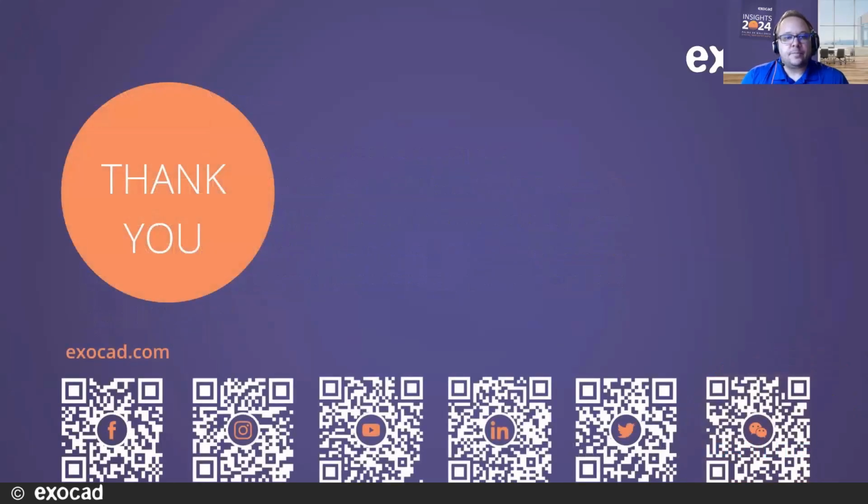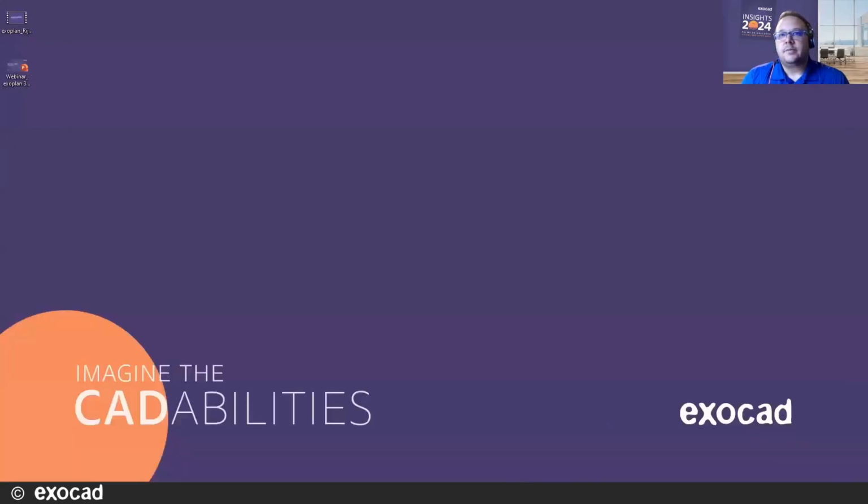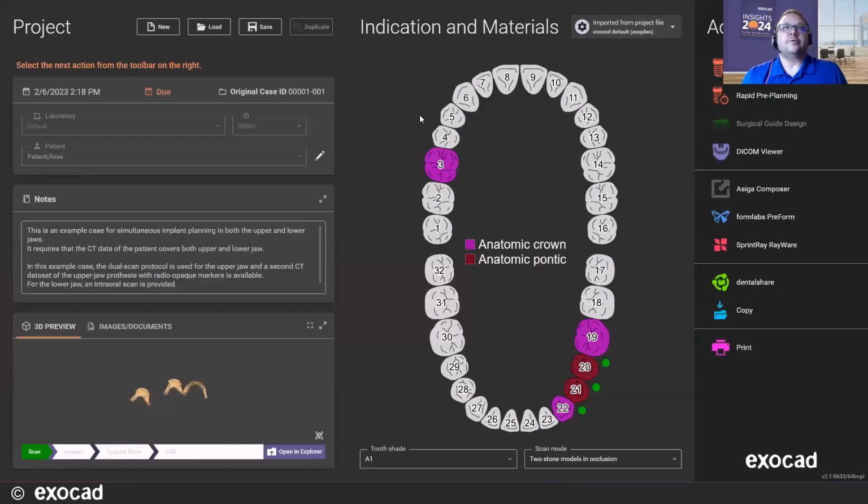So today, we're going to go ahead and close out of our PowerPoint and pull up our exoplan implant planning DB. So for today's session, we do have a case that is set up for upper and lower implants. Today we're going to focus primarily on the lower implants. So we can see we have a bridge here. We have implant sites for tooth 19 and then tooth 22.